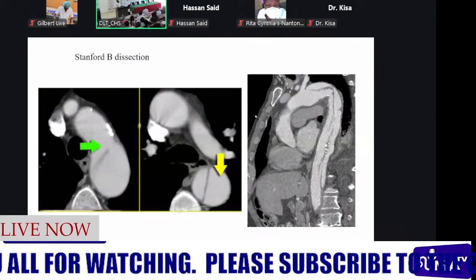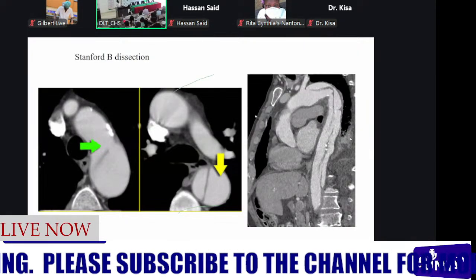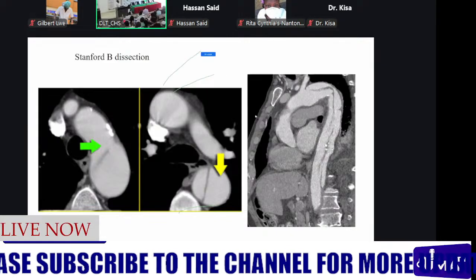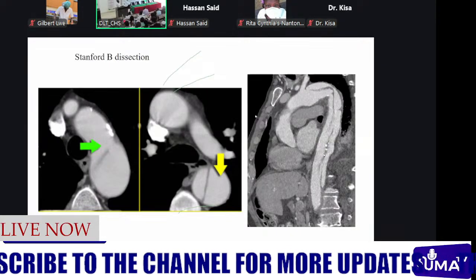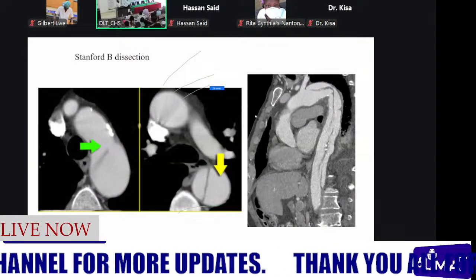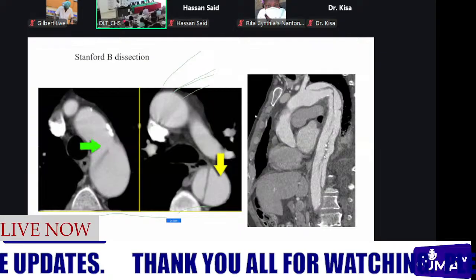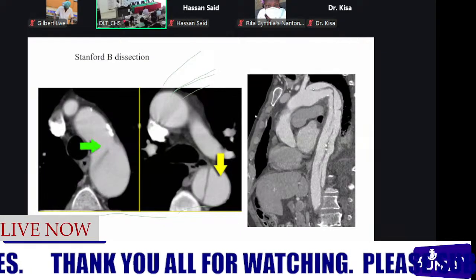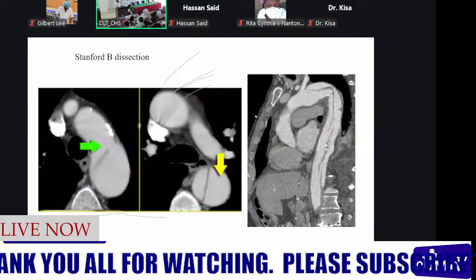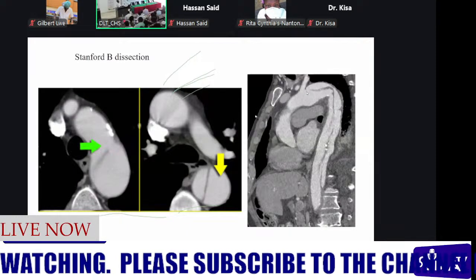And to note, in aortic dissection, since there is a tear with blood tracking behind the intima, the intimal calcifications will be displaced medially. And we can appreciate it here in this sagittal image. So for Stanford B, that is it. It starts from the portion that is distal to the origin of the left subclavian artery.